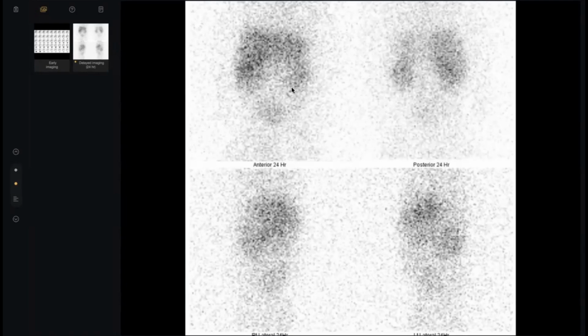Really brilliant. My colleagues, if there is any excretion to the bowel, you will see the bowel here, a serpentinous tubular structure. Not like this: this is the liver, this is the spleen. But the bowel, I will show you later on a normal HIDA scan. But at least this is very common. Do you know, my colleagues, we have been presented twice with this HIDA scan in the exam within 1 year, two times. Very important and very easy.